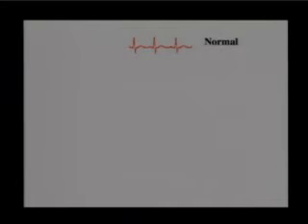These people faint a lot. Sometimes your second-degree heart block patients faint. First degree probably don't even know they have the issue. Let's look at some rhythms.